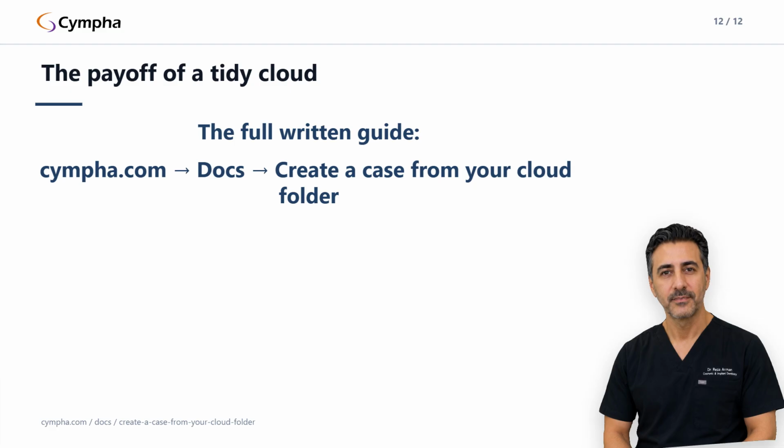The better your folders, the more case creation shrinks to just the clinical form. If your files aren't in the cloud yet, start with the file management lecture. If you're not sure the files even need a case, the sharing lecture covers the lighter handoff. And once a case exists, the studio lectures show you what review looks like in the browser, measuring, annotating, and walking a plan without a desktop install.